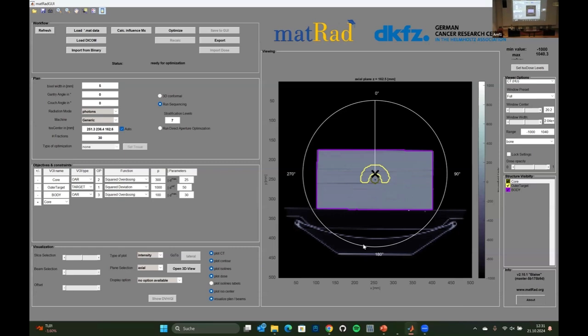It doesn't tell us something about dose, but for that we have asked the operations research engineer to build us an optimizer, and you can click on optimize. This is usually the step where we get one or two complaints that it doesn't work, because there might be an incompatibility between the new M1, M2, M3 Max and the old MATLAB, which was still compiled for Intel Macs.